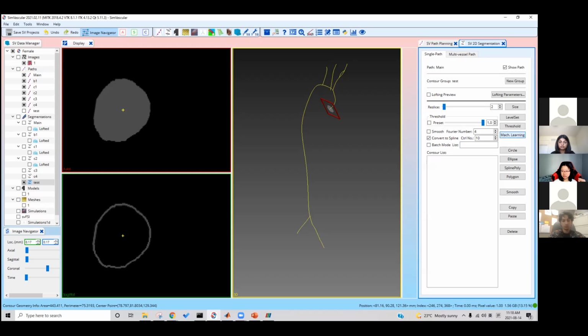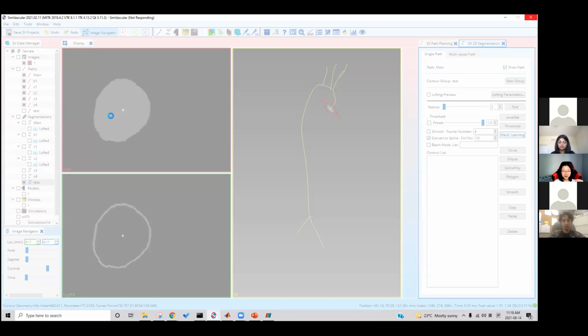Machine learning is the one function that I never got to work for my model. I'm not sure why, and it lags my computer significantly, as you can see. I hope it's going to finish within the next minute. Anyway, I never got it to work, but apparently it's great for batch learning as well. I might have to restart this. It just crashes.